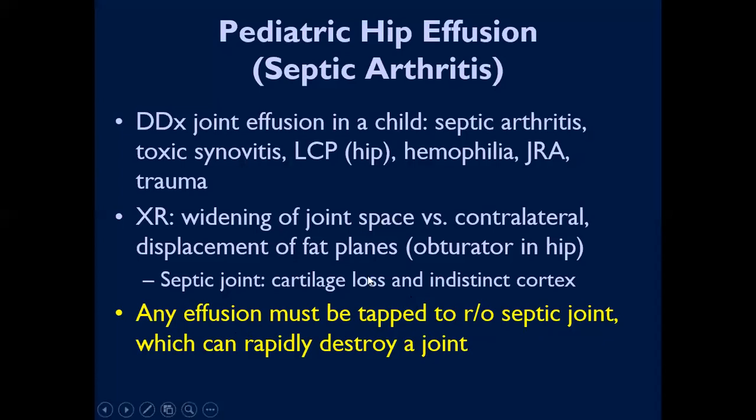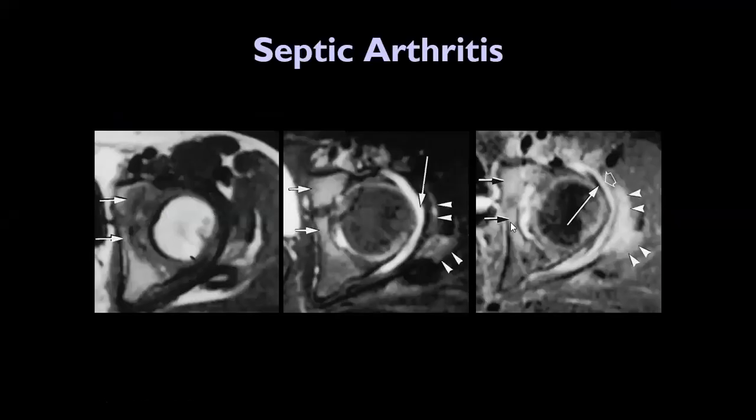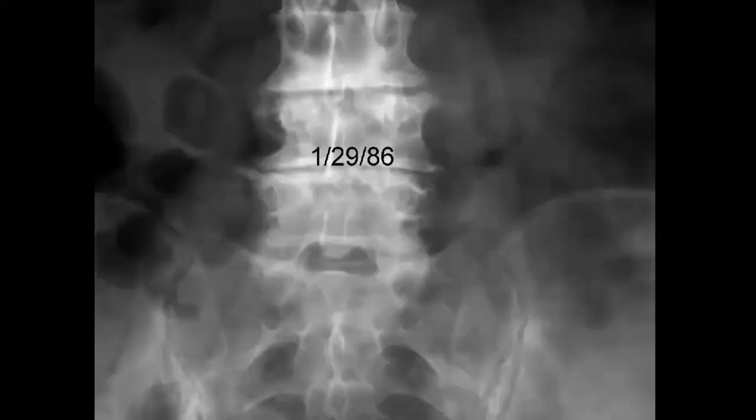So this is very critical to mention, that one of the most important is septic arthritis. Sure you can include other differentials, but septic arthritis should be in your top differential, right? If you want to check the MRI, I have here one picture for MRI in the post contrast. You can see the enhancement and the effusion, you have the full picture, but not all patients can have an MRI. So ultrasound and X-ray are important.